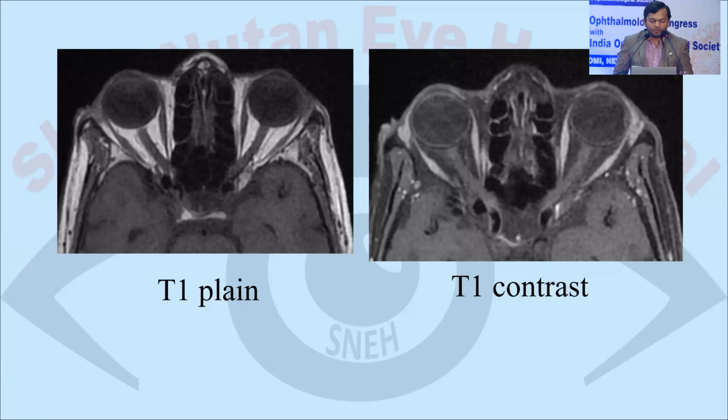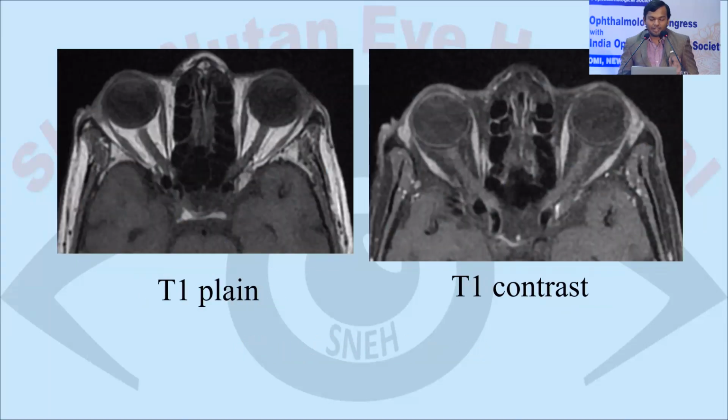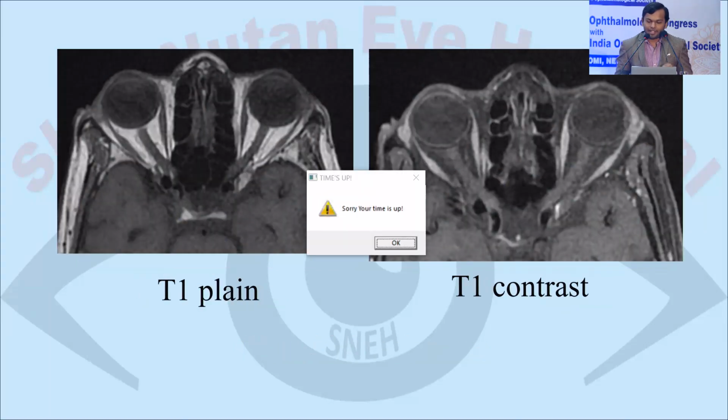Again, we have T1 and T1 contrast weighted images. I'll skip this.